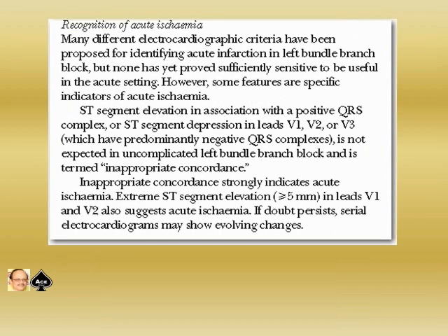The recognition of acute ischemia. Many different electrocardiographic criteria have been proposed for identifying acute infarction in left bundle branch block, but none has yet proved sufficiently sensitive to be useful in the acute setting. However, some features are specific indicators of acute ischemia.